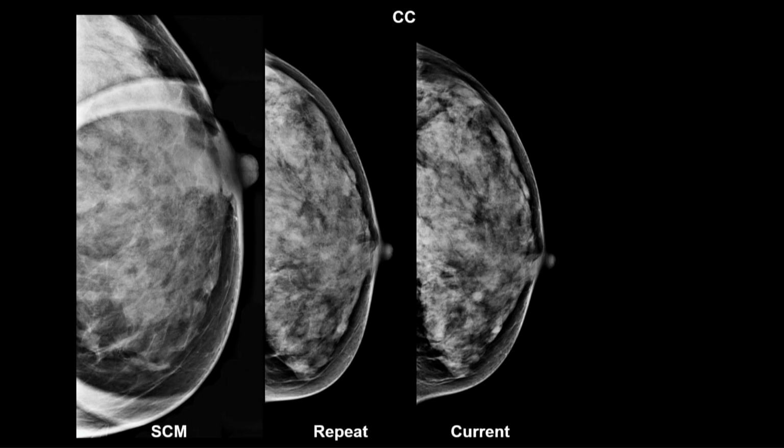In this particular case, this is not visible in the same location, and you only have to look in the same location as you had before. If the images are taken in almost the same projection, you will know exactly where to look because you have landmarks. This area here is the same as this. Our finding has got to be in this very small area here, and it's just not there.